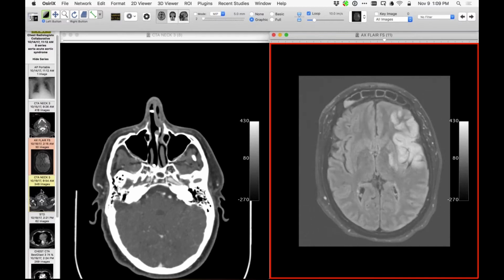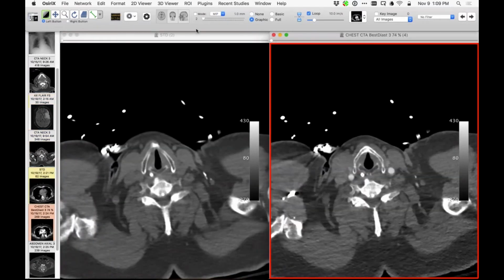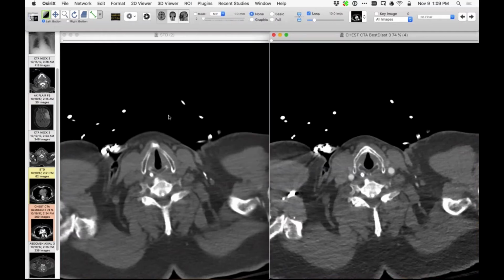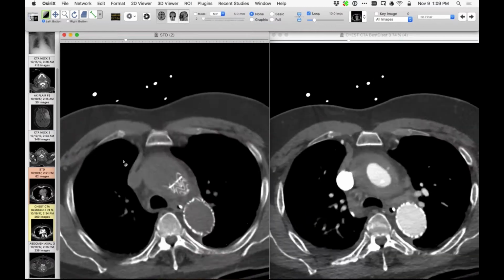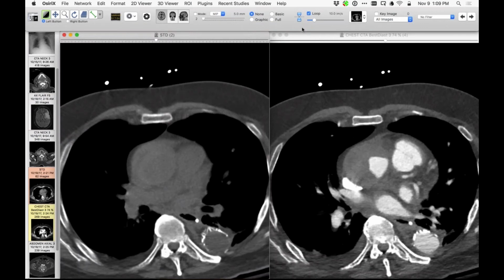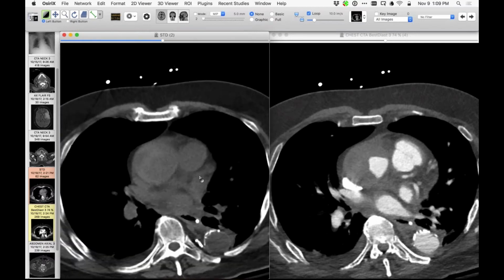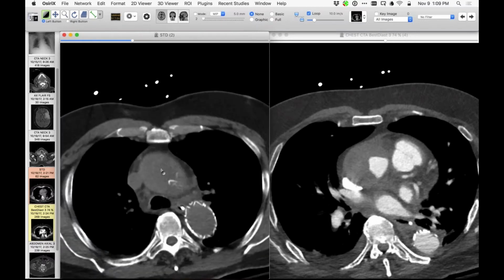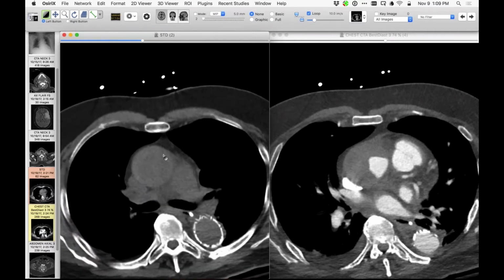So what followed that neck exam was a CT, and here we have our usual routine where we have both the non-contrast and the contrast. So they're actually linked there. So let's have a look. I'm going to try and unlink them for a moment and try to bring out the hyperattenuating crescent of intramural hematoma in the aorta.